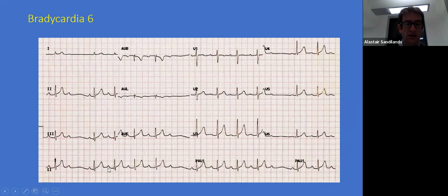So you can see that the PR interval is okay. The PR interval gets longer here. AV node is being stretched. It can just about take it. Yep, AV node's okay still, but taking it's harder. AV node is stretched again, longer. P wave, AV node can't take the P wave, drops. Reset, the AV node now resets itself. P, QRS is okay, longer again, longer again, longer again, drops. P wave doesn't go to the AV node. Okay, it starts off again, P, QRS, T, it gets longer.